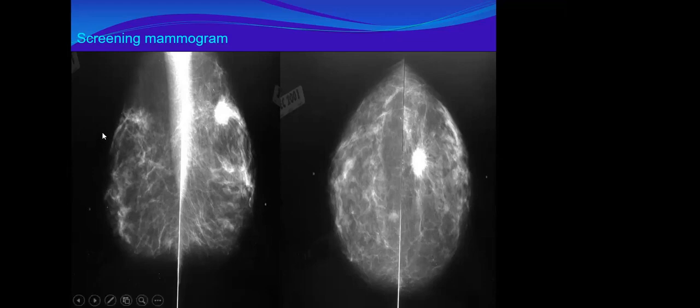Can I help her? I think there is a small lesion within the right breast posteriorly. Excellent. Inner posterior. This one? Okay. How do we describe this one? It's an area of asymmetry, as it's not appreciated in the other view. It is not seen in the other view?